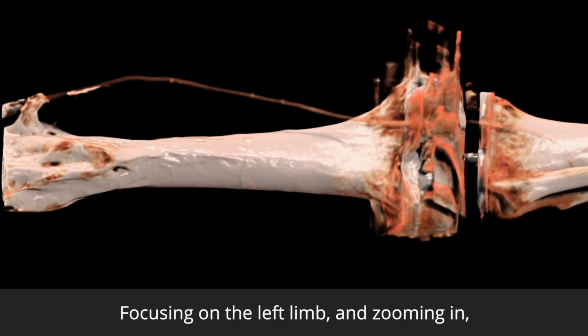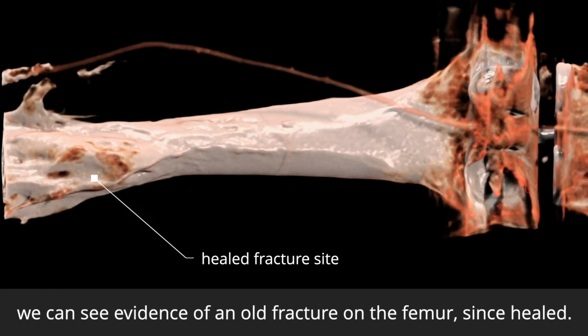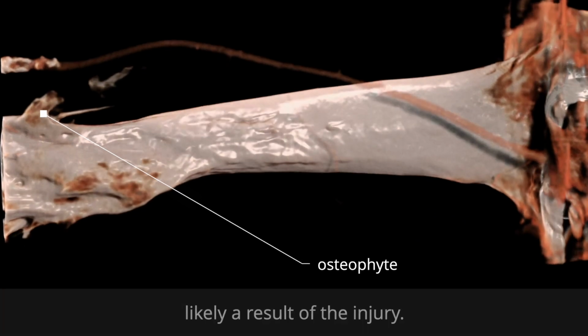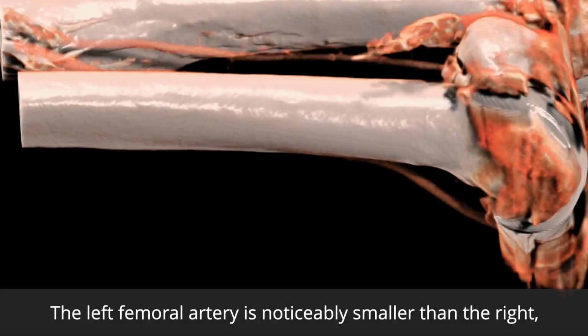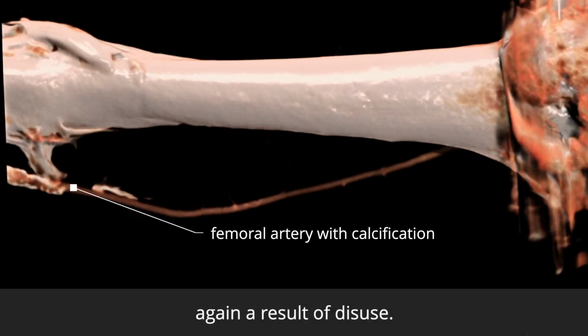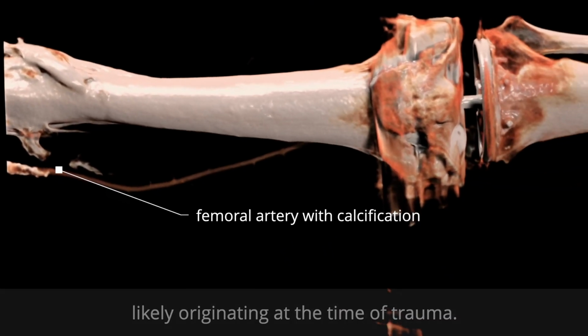Focusing on the left limb and zooming in, we can see evidence of an old fracture on the femur, since healed. We can also see osteophytes or bone spurs, likely a result of the injury. The left femoral artery is noticeably smaller than the right, again, a result of disuse. The artery itself has some calcification, likely originating at the time of trauma.